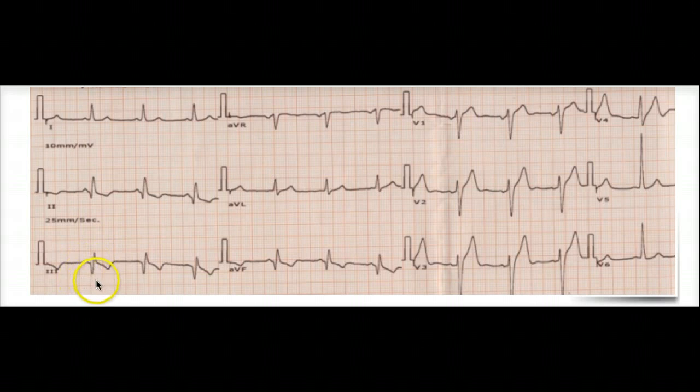I'm showing you old infarct and new infarct so that you can pick it up faster. Again, we see a Q wave just as big as our R wave. And where else do we see it? We see it here as well. The Q wave is quite big, showing that this is an old infarct because this is not followed by an ST segment elevation.